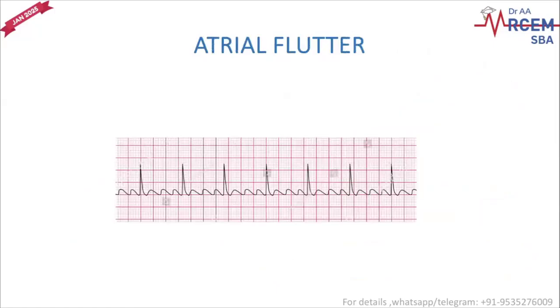First, let us see what is atrial flutter. Atrial flutter is basically fluttering. It is just vibrating. It is like vibration of the atria that you are having. There might be some contractions also. Okay, it is not literally vibrations. Literal vibrations is more often fibrillation.